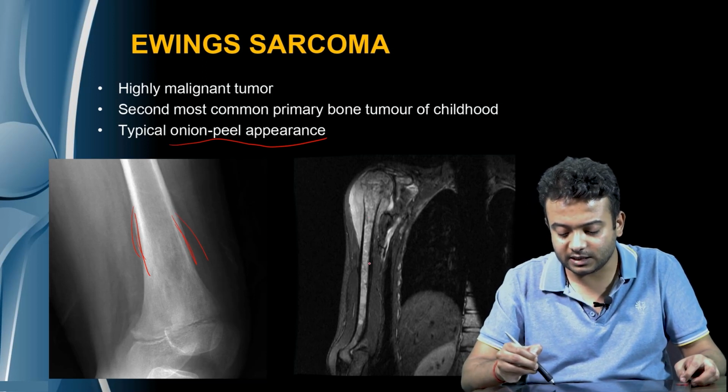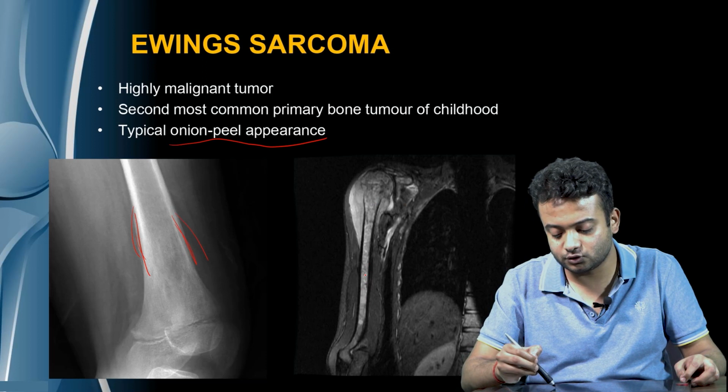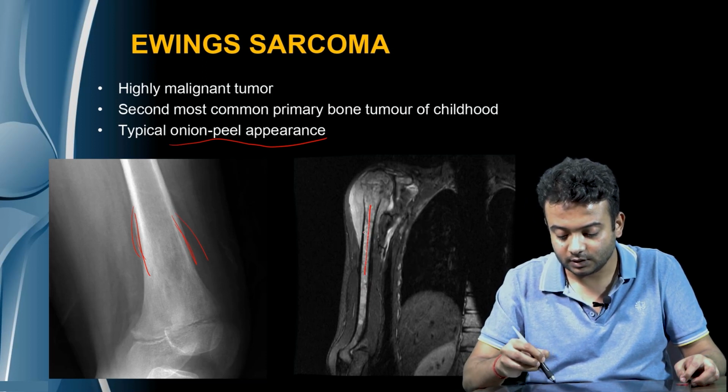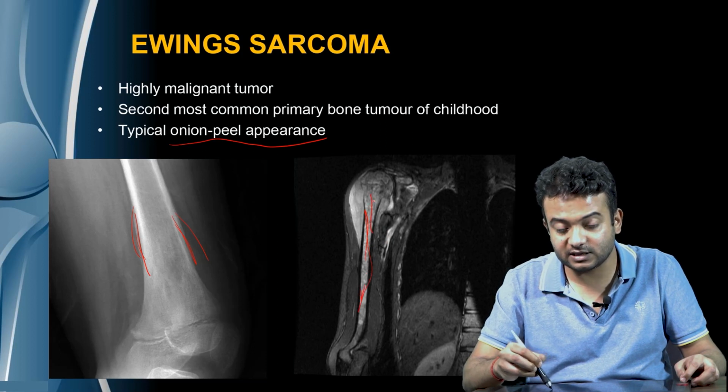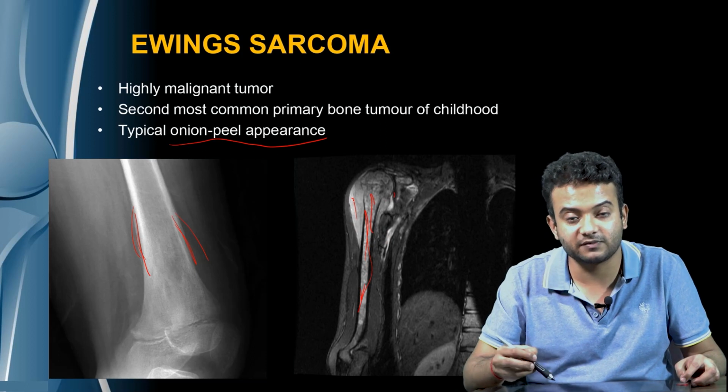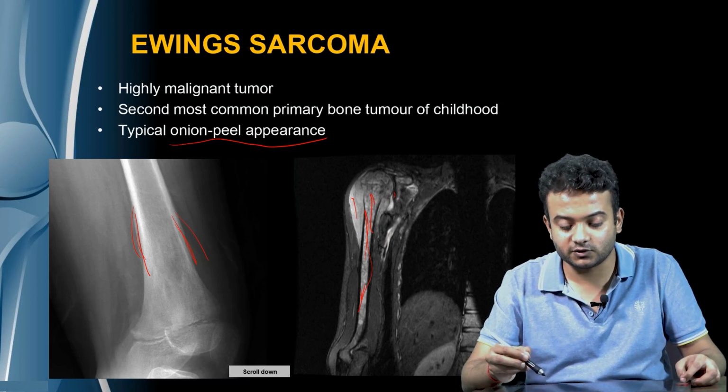It can even extend, as shown in this MRI. It can extend throughout the diaphyseal end of the bone, with extensive extension into the surrounding soft tissues as well.